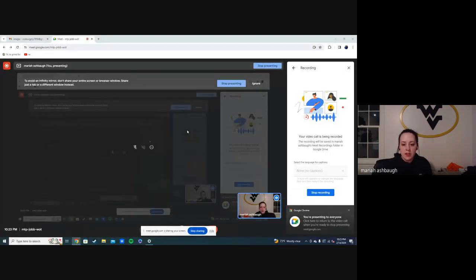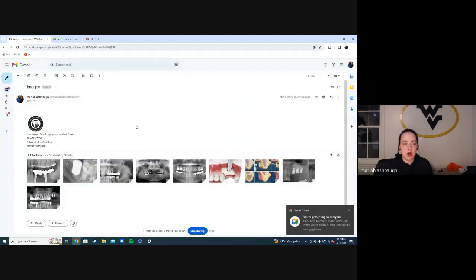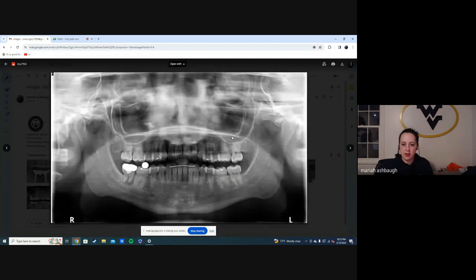So everything that I show, all of the x-rays that I'm going to show, are just off Google. Nothing is secure patient information. So I'm going to start with, let's take a look at this panel.